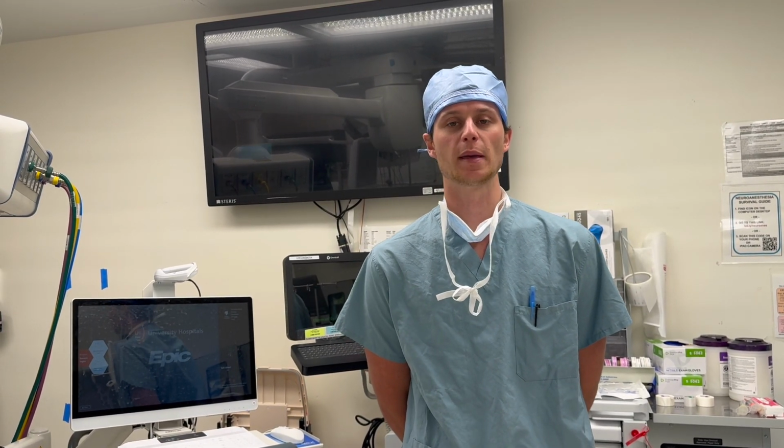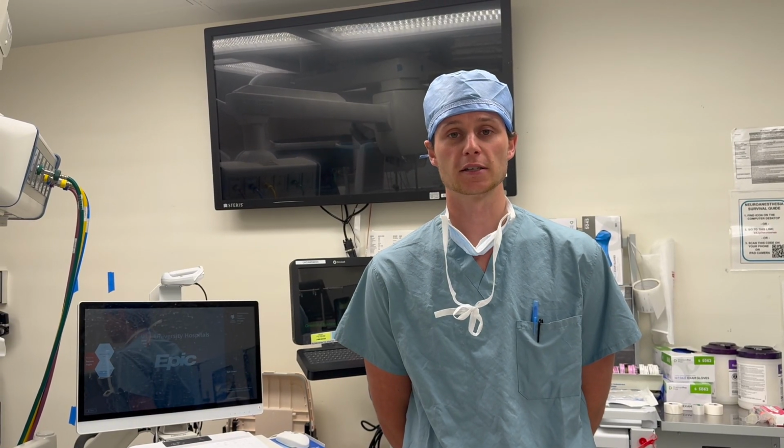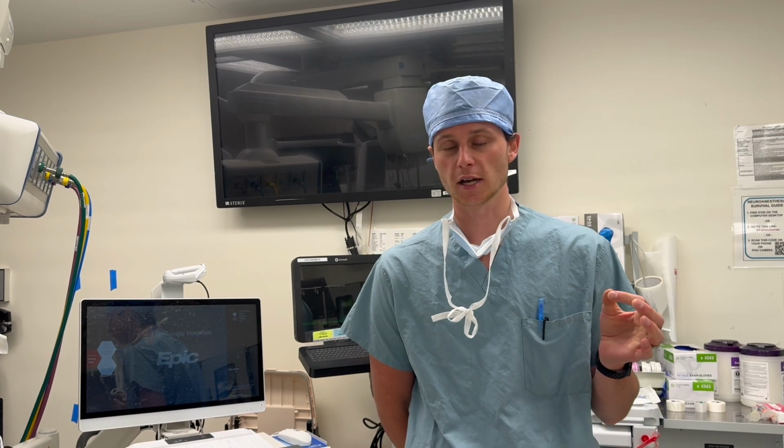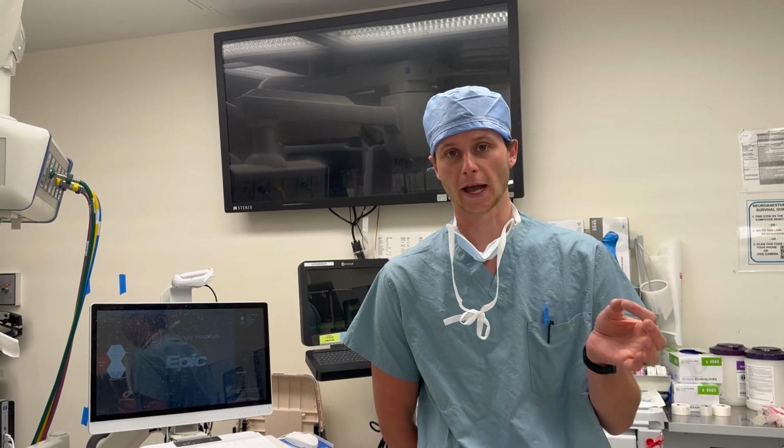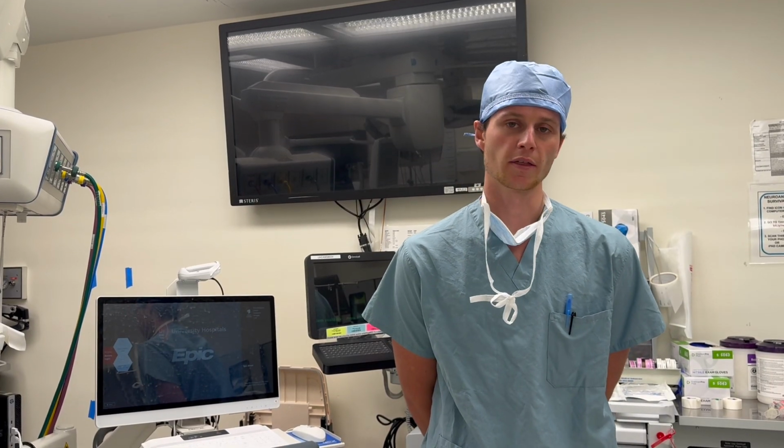ENT cases are typically where you're going to get a lot of your difficult airways, or at least abnormal airways. It's a great rotation for practicing different airway skills, getting familiar with different airway devices and ET tubes, as well as getting comfortable with other people messing with your airway. A lot of the ENT surgeries involve the surgeon adjusting, disconnecting, pulling out, and putting back in your ET tube during the case. Something you'll get more comfortable with as they go on.